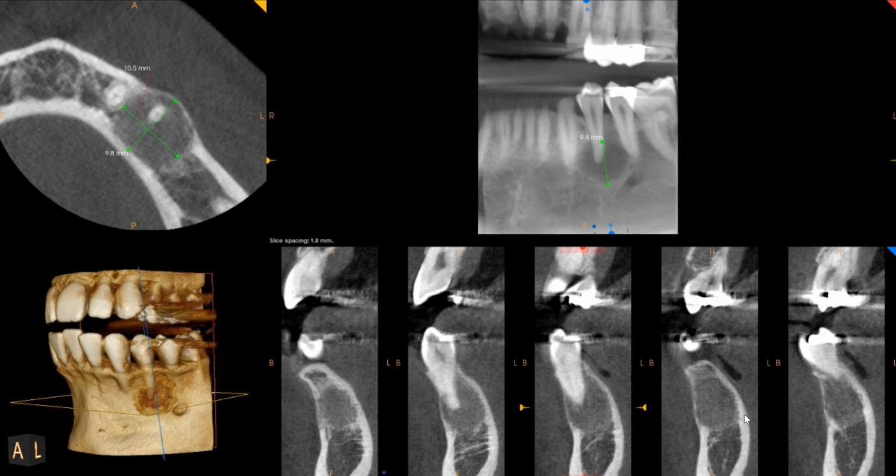So I think we're looking at a simple bone cyst when you combine the histologic findings and obviously some assumed clinical features. That's what I think it is. But I wanted to share it with you just because of the interesting radiographic features and the fact that this does not look like any of the common lesions that we typically see.